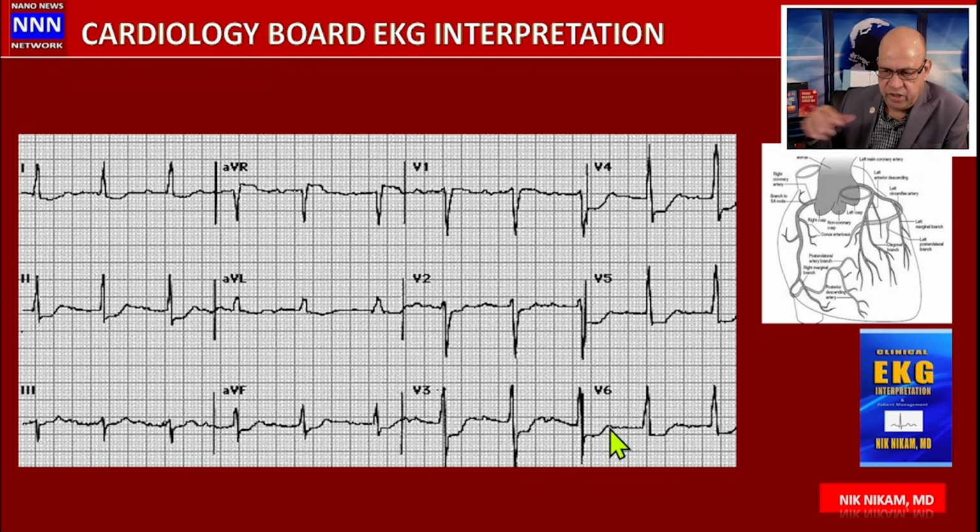Of course, this comes in the following segment after the myocardial infarction, which is titled STT abnormalities. So we are covering that segment also in this, which is good. So whenever you see horizontal ST depression in multiple leads or groups of leads, and if the patient presents with chest pain, consider subendocardial ischemia or infarction if it is associated with elevated biomarkers like troponin.